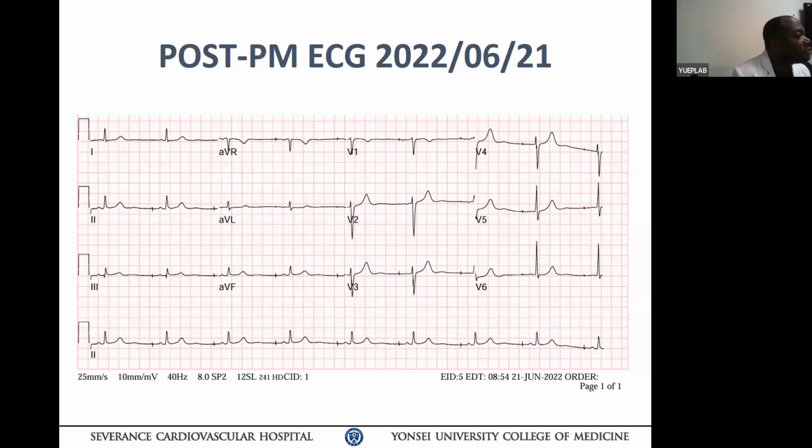And there's latency also. The pacing-to-P wave interval is quite long, the latency into capture. It's not uncommon to see the pacing marker and then the capture manifested as a P wave on the ECG. That's the reason we talk about it all the time. If you are going to program AV delay, you had better do it under a 12-lead ECG, not by the pacemaker programmer. The pacemaker is going to show you I'm pacing, like the Q, P, and R, and so on. That does not reflect the patient's actual electrical activities.